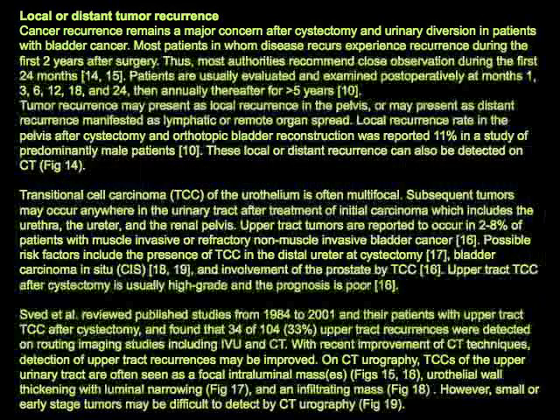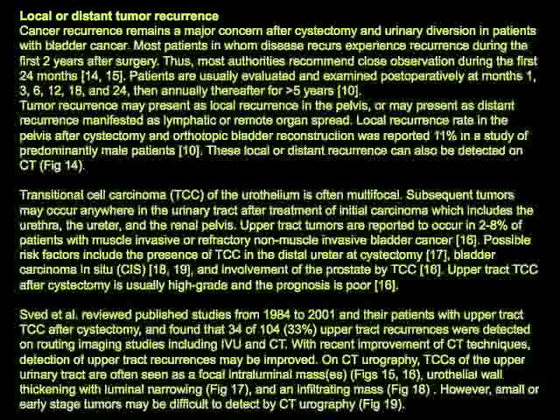Now, once you talk about long-term complications, you talk about tumor recurrence. Tumor recurrence is what you might expect: adenopathy, recurrence in the surgical bed. Most people will follow the patients annually. And again, tumor recurrence can occur almost anywhere. Liver mets are uncommon without other disease. With transitional cell carcinomas, they're often multifocal, so contralateral renal involvement is possible.